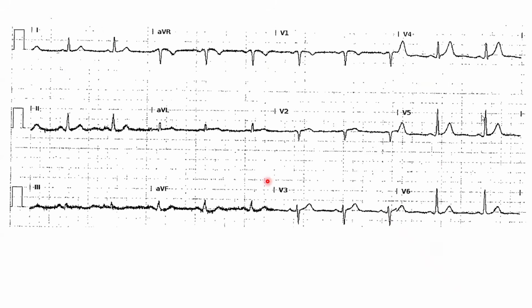This is an EKG of a 61-year-old woman presenting with chest pain and diaphoresis that started 1 hour previously. This EKG may be read as normal in an asymptomatic patient if you're reading just a stack of EKGs, but with her ongoing distress, you have to seek those mild features of subtle STEMI. In this case, we have subtle Q waves in leads V1 and V2. You have subtle ST depression in the inferior leads. You see it here in 2, 3, and aVF.